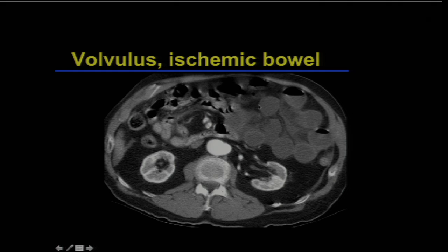In the contralateral abdomen, we can see dilated segments of bowel. In the mesentery, we have interleaving pockets of fluid that are kind of triangular in shape because they're between the leaves of the mesentery. We can see distinct fat stranding of the mesentery leading up to the dilated segments of bowel. And then we do not see bowel wall enhancement in several of these segments of bowel, so non-enhancement of the bowel wall. And in some segments, we do see some enhancement, but it's only very mild.